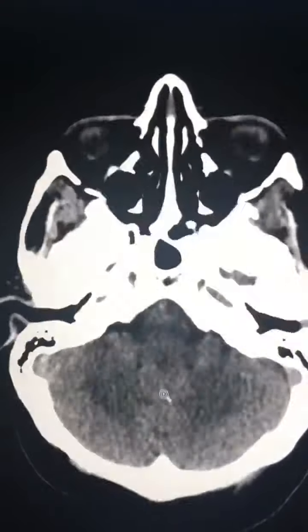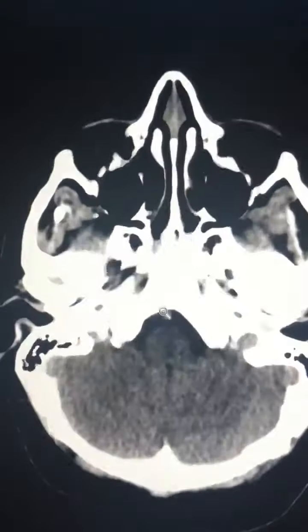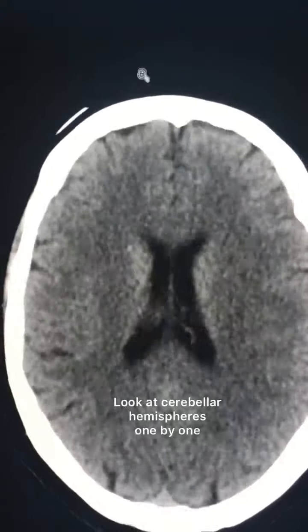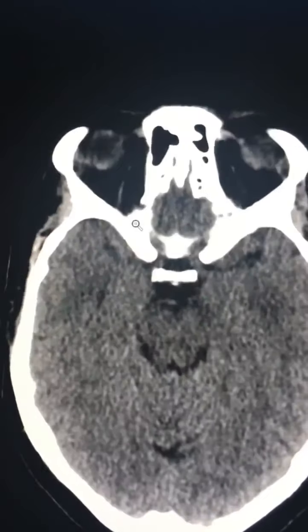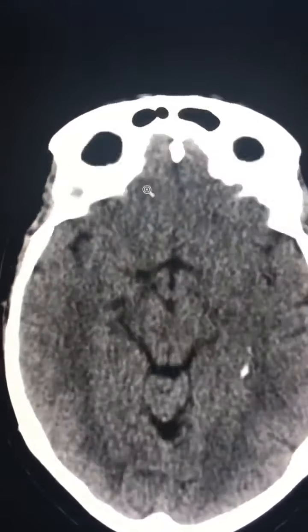Then go down again, look in the back, look at the cerebellum. You can look at one side of the cerebellum at a time, come down, look at the other side of the cerebellum, come up. Okay, so we have covered both the cerebral hemispheres, the brain stem, and the cerebellum.